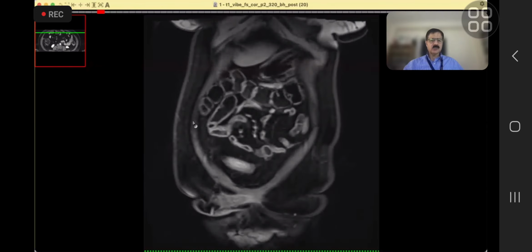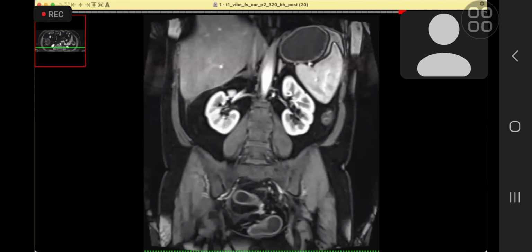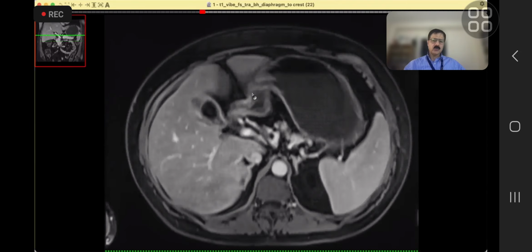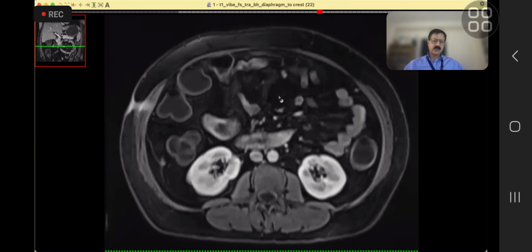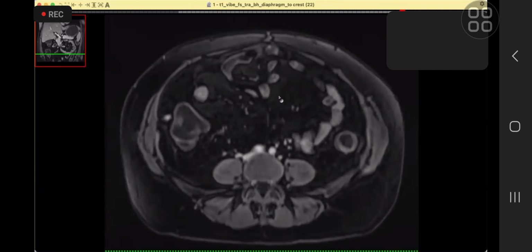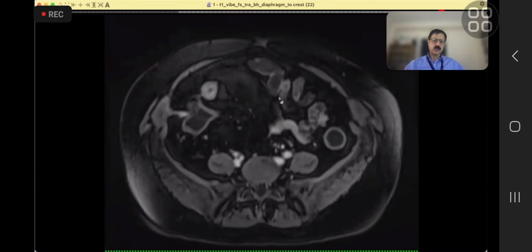the region. Just one second, please. Dr. Khan, can you scroll for me, please? Because I think it's very hard. Okay, I am now going to scroll. Will be much faster. Thank you. This is a T1 weighted post contrast. Just hold on. Let me give you a few points and then I'll ask you to take over.